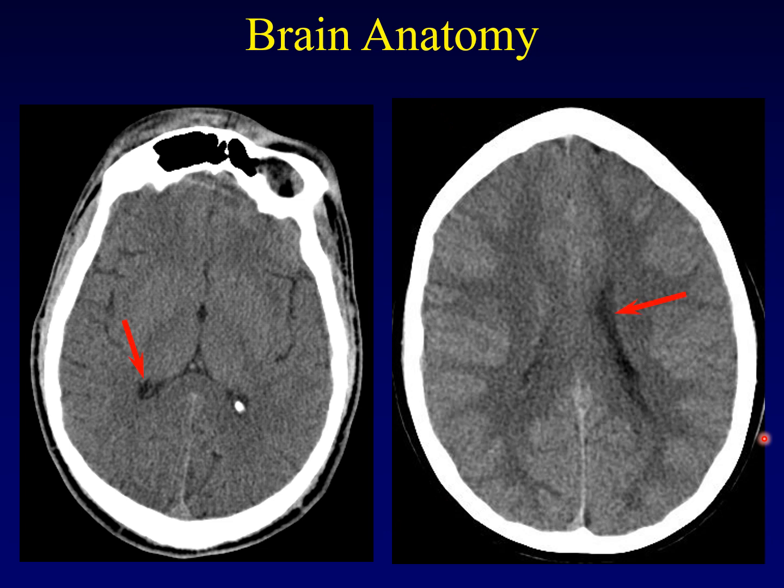Well, how about these things? I'm pointing to the darker objects here, a little bit there, this item there. What are these dark objects? Well, water is going to be darker on CT, and these water-filled objects are the ventricles. In the case of the arrows, the lateral ventricles, pointing to the body of the lateral ventricle over here and the atrium of the right lateral ventricle over there.